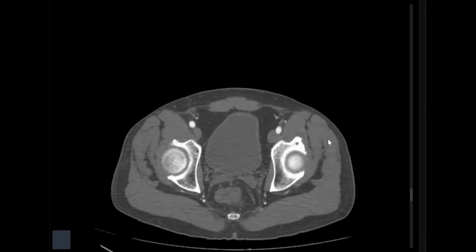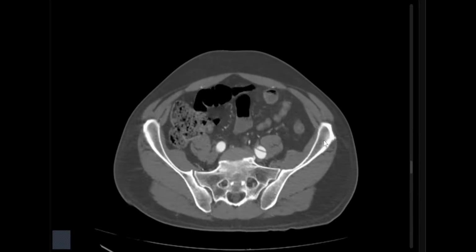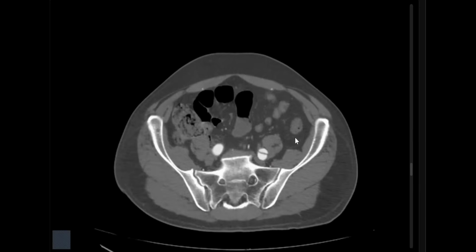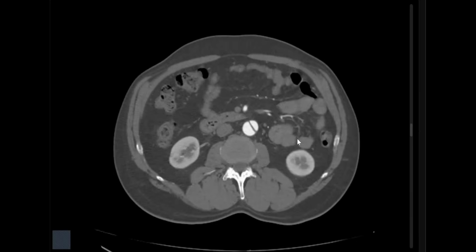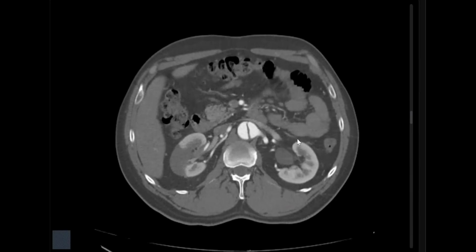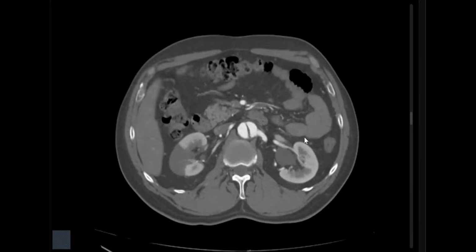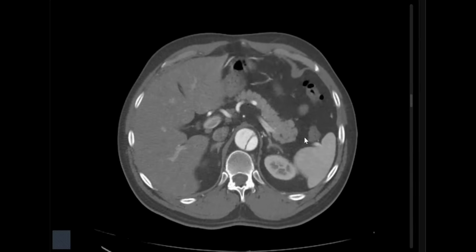Okay, so far I can see that the iliac arteries and their branches are opacified, and there is a wedge-shaped infarct in the right kidney, where the right renal artery is arising from the false lumen, resulting in the complication. Very good.